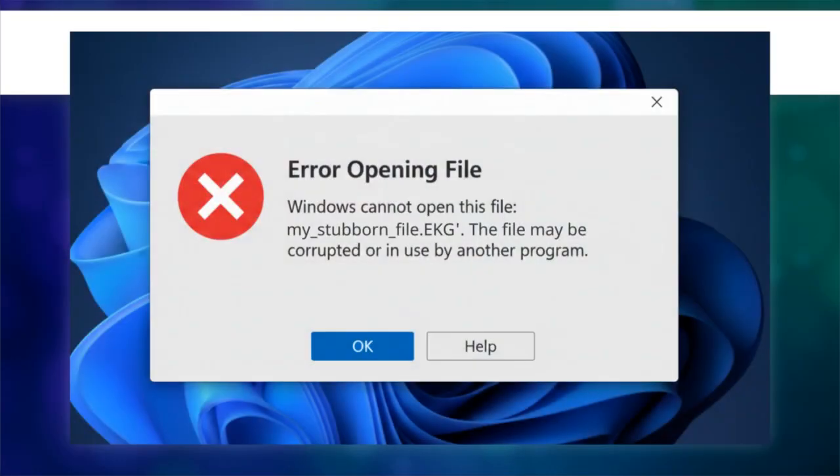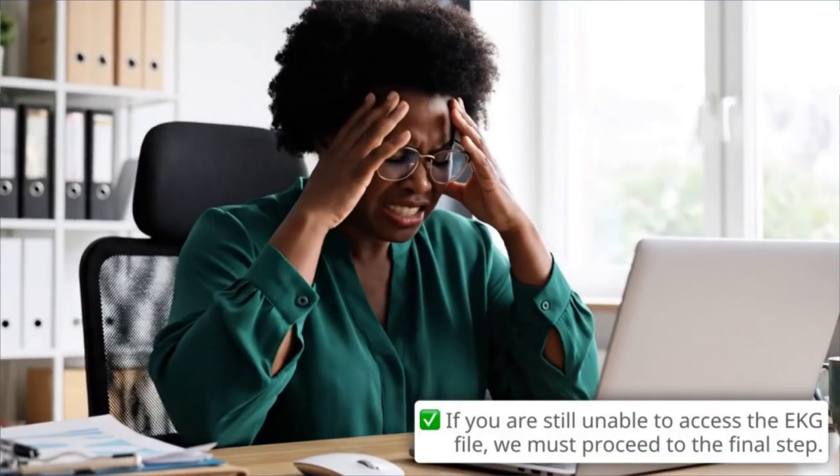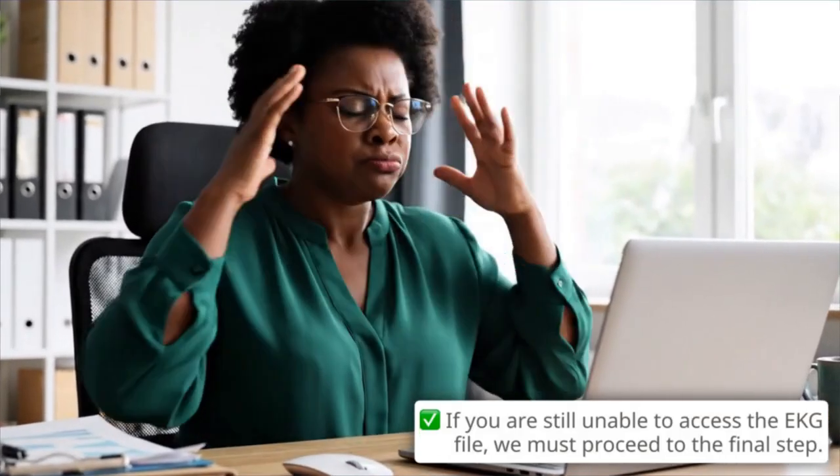If your EKG file isn't cooperating, don't worry. The file is resisting, but it's not random. It's one of 3 predictable basic problems. Here's a quick checklist of these common culprits and their immediate solutions.